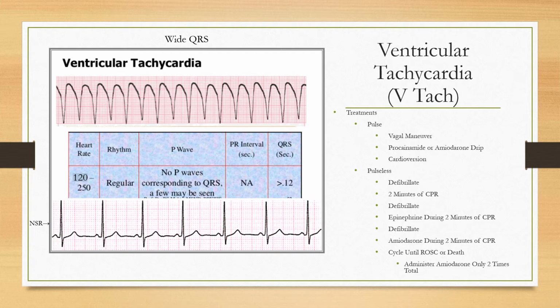Okay, let's look at the rhythm at the top left there. So that is ventricular tachycardia. So what's happening is, as I said, the ventricles are stuck in this electrical loop. Those are all QRSs that you're looking at. Okay, so those wide, peaked, they look like mountains. Those are all QRSs, one after the next after the next.